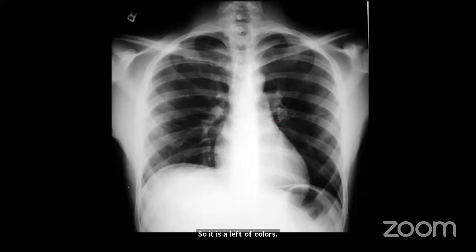What do you see here? Is this X-ray normal? We can see that it is well oriented, well centralized. Exposure is good. The lungs are clear. The clavicles are good. There are no rib fractures. The heart is good. The hilum is good. So what is not good here?